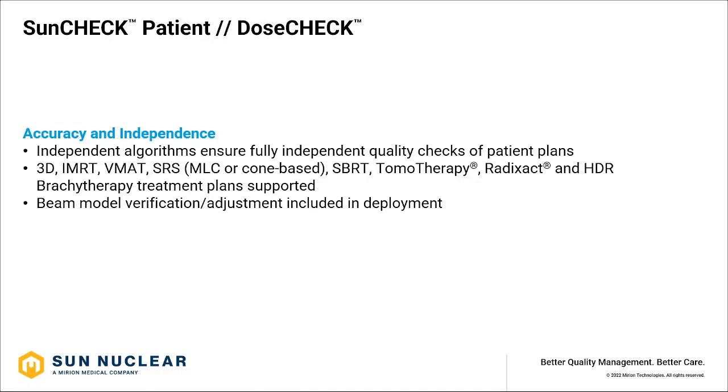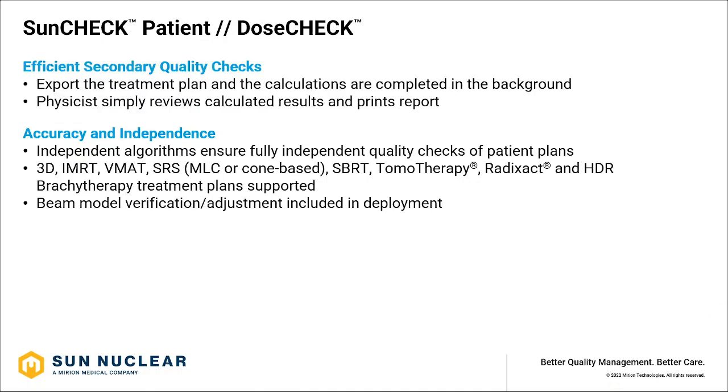Within Sun Nuclear, we have a special team called SunDeploys, who are responsible for creating a beam model for your clinic, as well as verifying that it matches your measurements, and the measurements are all within a certain tolerance. To perform a secondary dose verification of your patient's plan in SunCheck, all that a physicist has to do is export the DICOM plan as well as the patient planning CT, and all the calculations are then completed in the background.